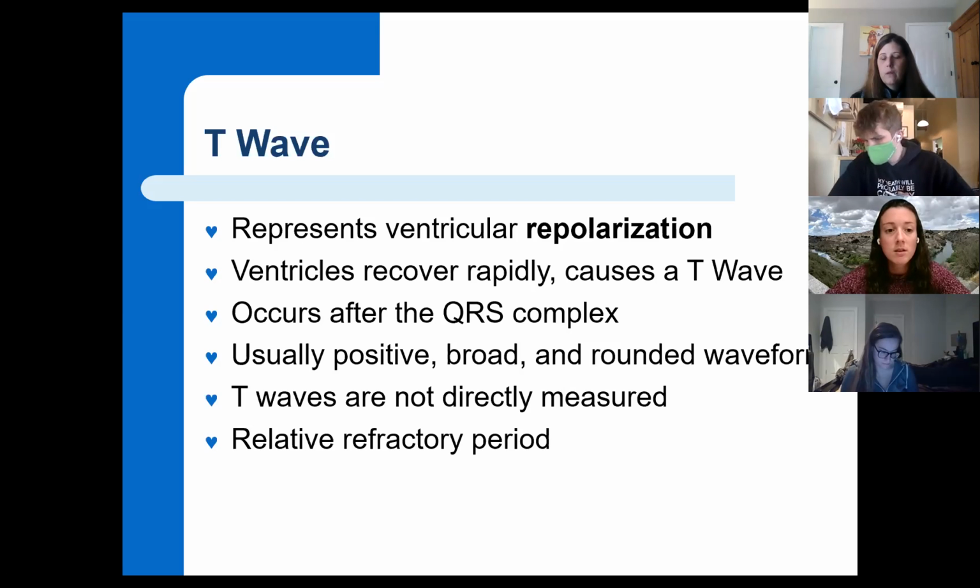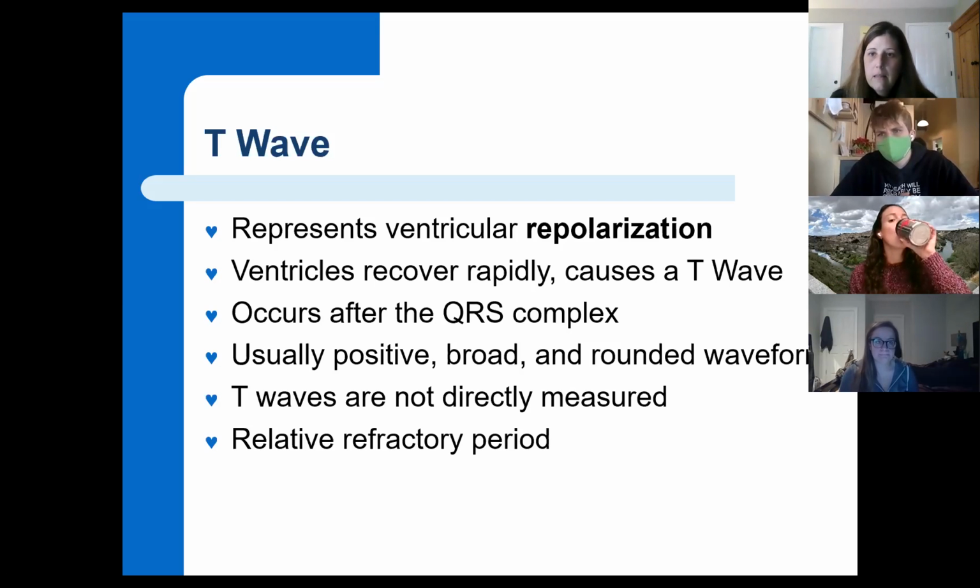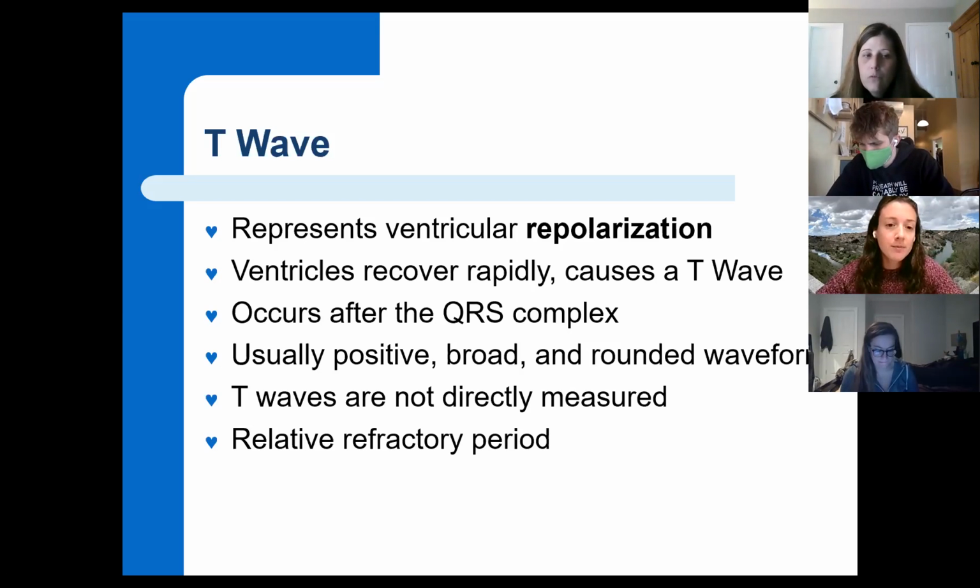Thank you. Those ventricles are so big, they have just done massive work. You've got to let them repolarize, and so you're always going to have a T wave. Again, it may not be nice and beautiful like the examples I've shown you so far, but it's going to be there. Okay?